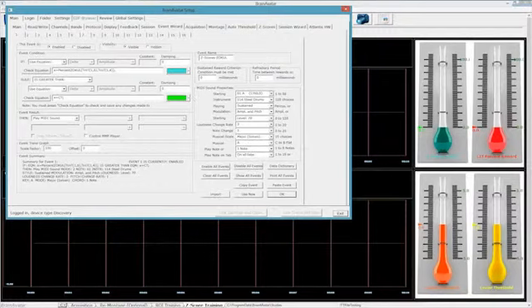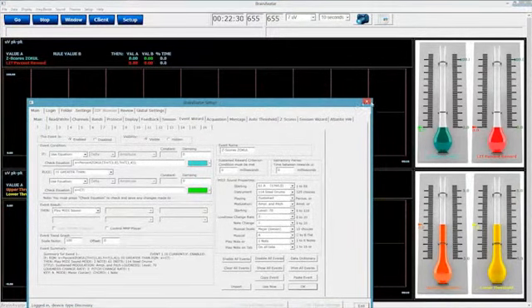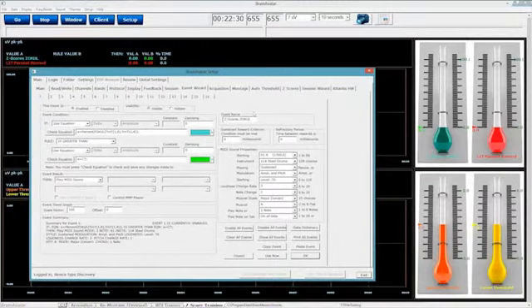The next thing that we have is our event name. Once again, those of you who are using the Discovery software or the 3.0 series software don't have this. In the latest BrainAvatar software, we have given the ability to name events. Now, what is the purpose of that? Well, you can see right here. For example, if I am doing PZOK UL training and I have a thermometer, whatever my training event name is going to be displayed on the thermometer I'm displaying. Also, to go a little bit further, I'm going to delete this.